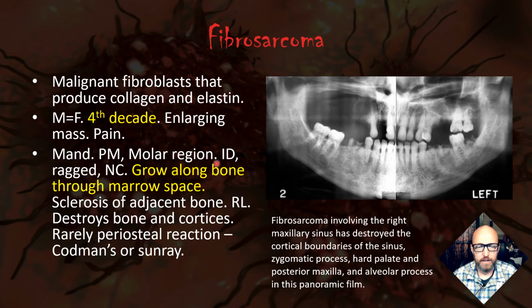All right, but as I said, there's nothing super distinguishing about this radiographically from carcinoma, from multiple other types of malignancy. So mainly be able to recognize the really destructive pattern of this and the ill-defined nature. What else is destroyed? Floor of the sinus I mentioned. My favorite structure, again, zygomatic process of the maxilla. In fact, you don't see the zygoma at all. Here you see the zygoma and the zygomatic arch extending back here. That's all destroyed here. So that entire side of the face has just been completely destroyed. The palate is gone on that side.